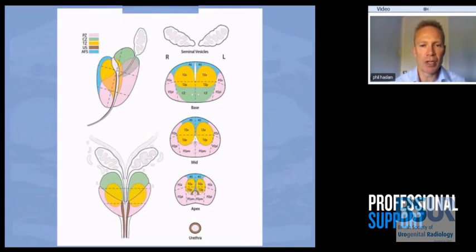What I tend to do is give the slice number with the abnormality, its size and its location, which our urologists can directly look at on PACS, and they can import that slice into image fusion software to allow more accurate targeted biopsies. And indeed, with the PACS system, which we're shortly to get, so I'm told, I'll be able to draw around a lesion, and again, that can be directly imported into their biopsy software.